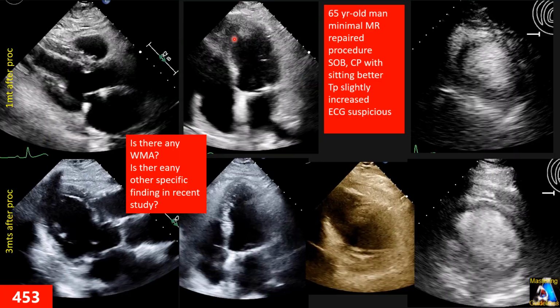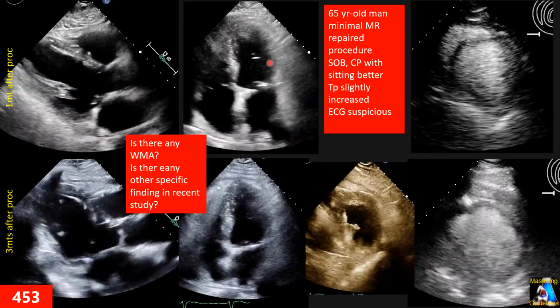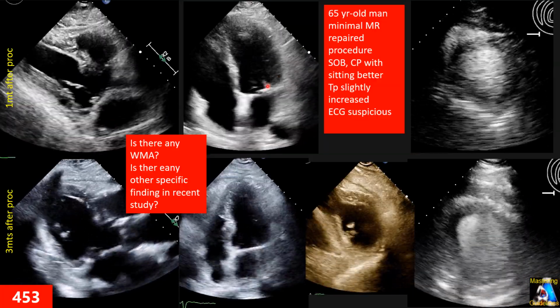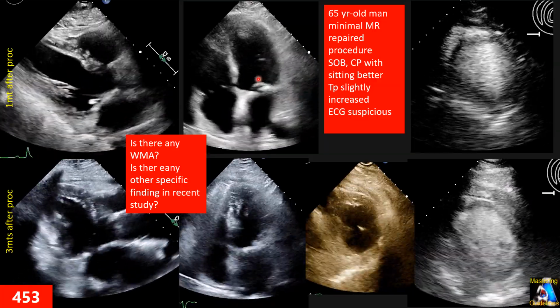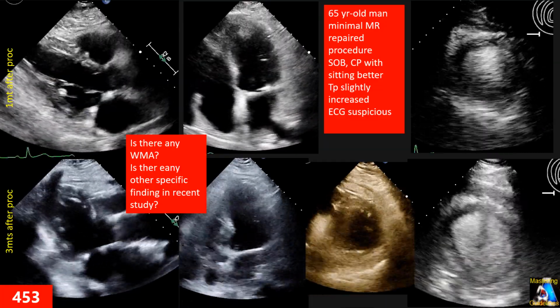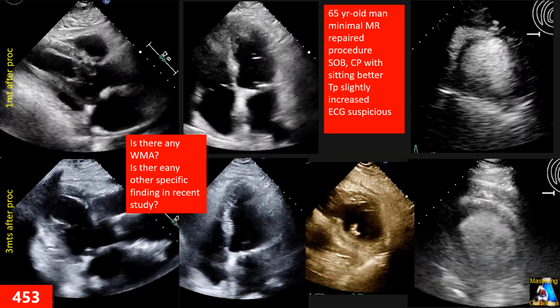There is one specific artifact, a very common artifact. Can you mention it? What is that, and how can you, without any other study, rule it out or not? Is it an artifact or real pathology? Now let's go to the next slides.